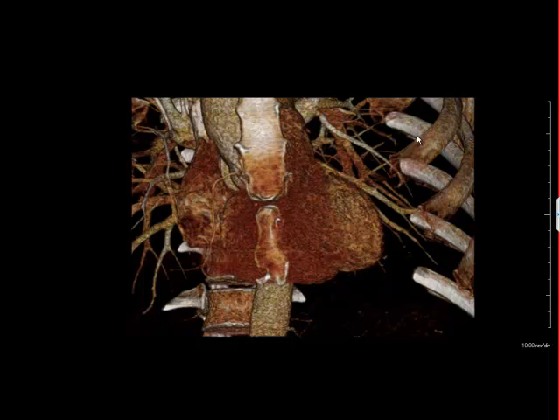This patient is a 48-year-old male with multiple risk factors for heart disease, including early positive family history, hypertension, and dyslipidemia with an LDL cholesterol of 146, who developed symptoms of dyspnea on exertion and had nonspecific findings on a stress test with ongoing symptoms. He was referred for cardiac CT angiography to rule out possible obstructive coronary disease.